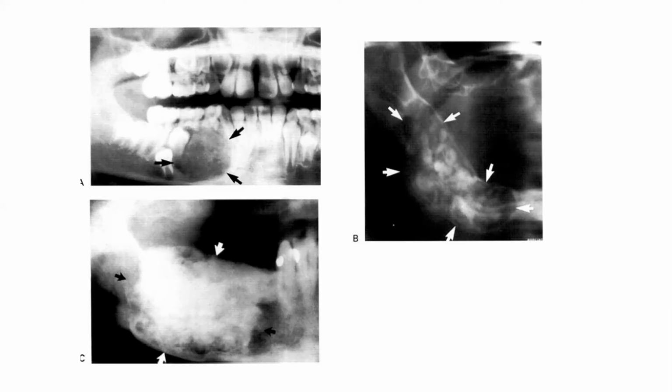Its radiodensity starts with being very radiolucent, and as it progresses, it gradually increases with radiopaque calcified patches. In the later stages, the radiopaque zones coalesce to form a densely radiopaque mass with or without a radiolucent periphery. The teeth are often displaced and occasionally resorbed, and the expansion of the surrounding bone in all dimensions is often demonstrated as a downward bowing of the mandibular lower cortex.